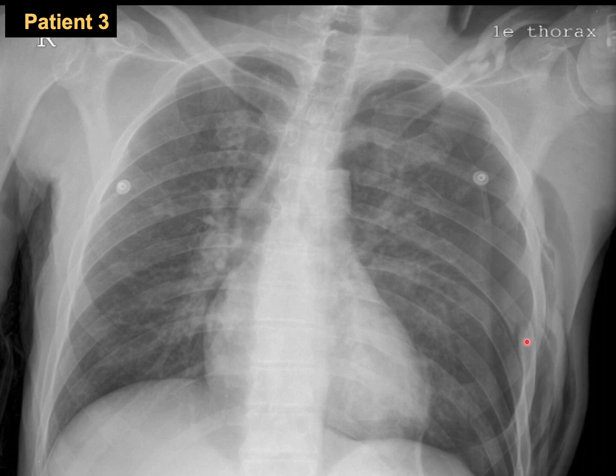A, B, C, D, E. When we go for E, which is everything else, we have said this is the electrodes. Don't be misled. And definitely you can notice that we have a surgical emphysema here. That's very well correlated with the pneumothorax and the multiple fractured ribs here. And again, don't forget the clavicle. Okay? Then this patient is having pneumothorax on the left side with multiple rib fractures, subcutaneous emphysema, and left clavicle fracture.